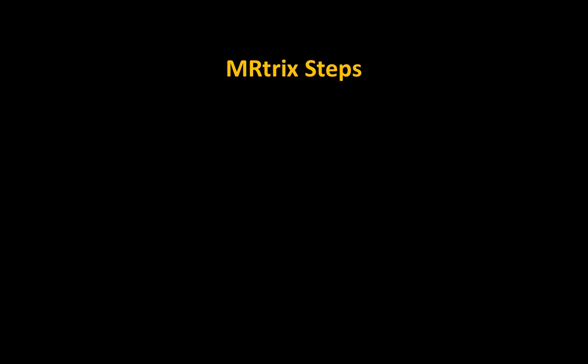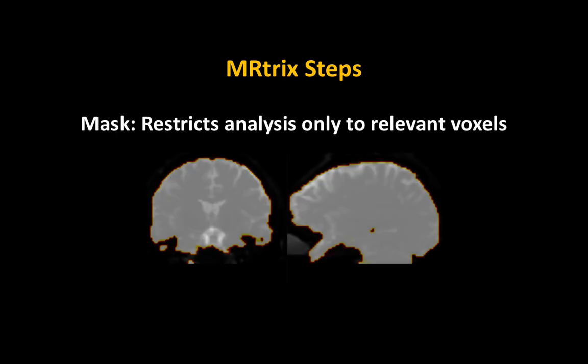So I'm going to show you that basis function and also another step, which is also very similar to fMRI analysis, which is to create a mask to constrain your analysis. Now, really, we do this for computational purposes. We don't want to analyze things that are way outside of the brain, even though we collect a field of view which incorporates a lot of non-brain voxels, mainly to speed up our processing and to constrain our analysis. So let me show you these two particular functions.